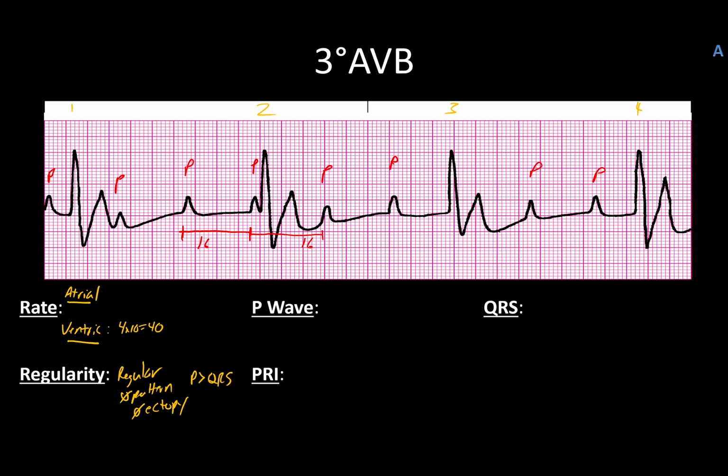But if I look at this, I'll notice that there's actually 2 gaps. I'm actually missing some of my P waves. I feel like there should be one in this zone and one over here. How do I prove it? Well, I can take from here forward. If I count forward 16, that puts it right here. And if I want to double check, I'll take this one and go back 16 and see it actually matches.